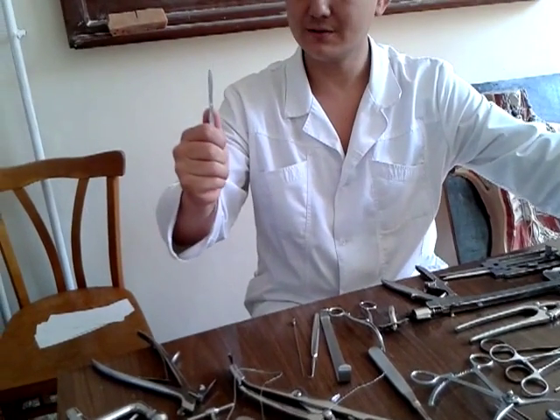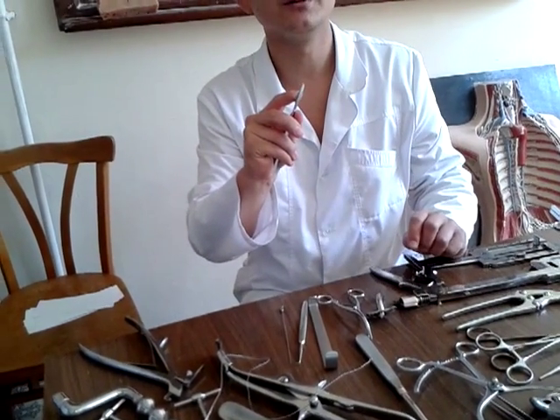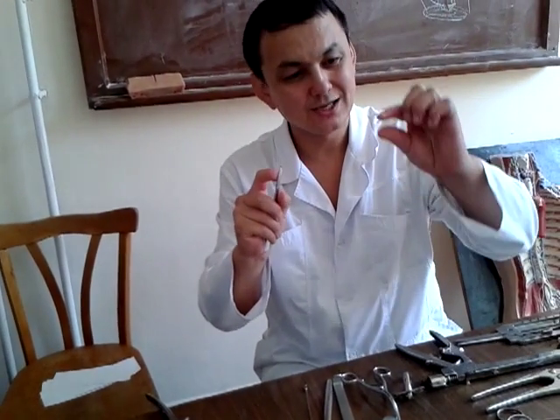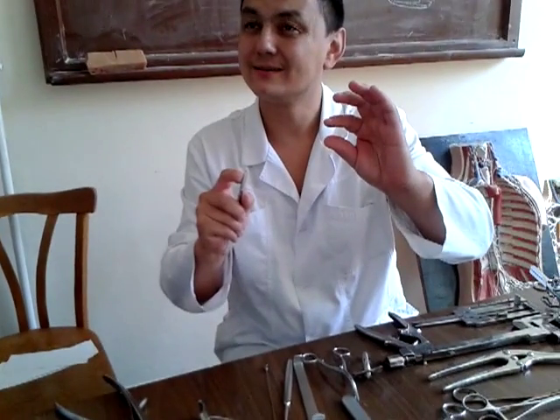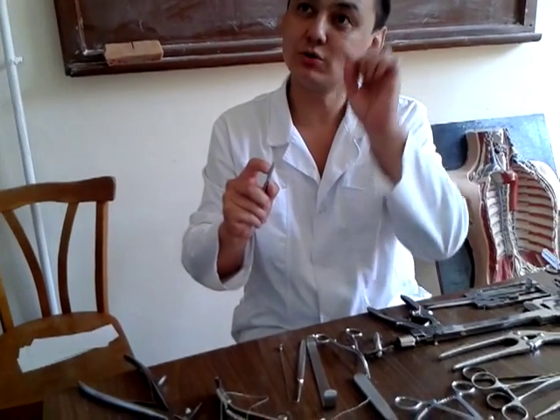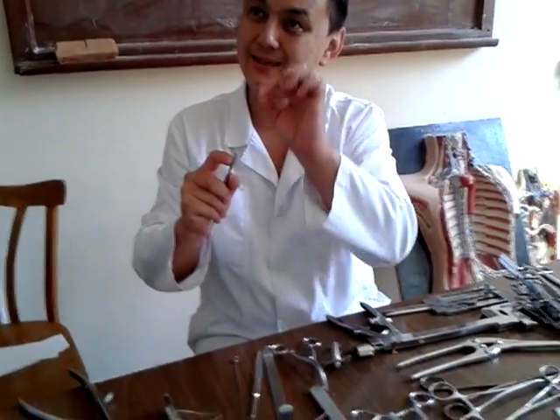And one more additional position is the limited scalpel position, when we limit the length of the scalpel, for example when it is necessary to cut only a small portion, only a few centimeters. For tracheostomy, it is very important to cut only the anterior wall of the trachea, so you must limit the length of the scalpel to cut only the anterior wall of the trachea.